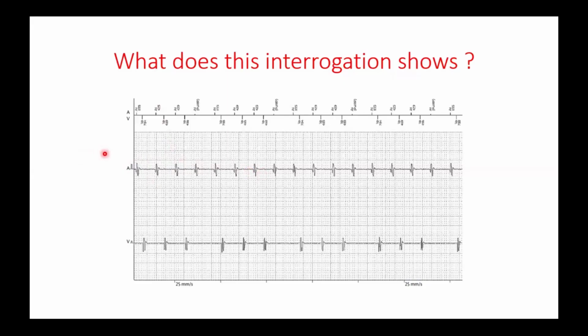So what does this interrogation show? I can't make it easier. Any answers?